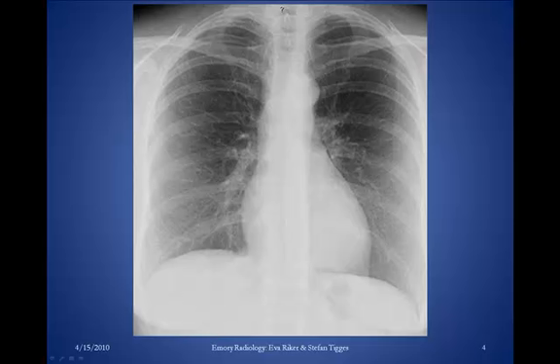If you have a radiograph, and we're going to concentrate on radiographs of the chest, the proper position for some of these lines is really not that difficult. An endotracheal tube obviously needs to be within the trachea, so that means it's going to be in the midline on a radiograph of the chest. You want it to be above the carina. You don't want it slipping down into the right main bronchus, because that's where it's going to go if it's put in too far. And we'll look at an example of a tube position in the right main bronchus, and we'll look at some of the consequences of being in an abnormal location.